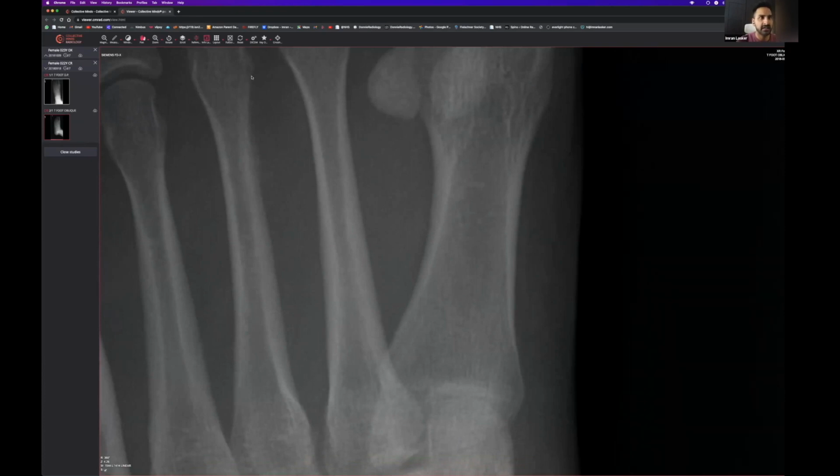And then you look at the third shaft. Can you see it looks a little bit hazy there? So I'll get the pen and draw it out. Look, going along like this, and then it doesn't look so crisp, and then it carries on like so. This side looks completely fine, but that side does not look good at all. It looks very irregular, very cloudy around there. So that doesn't look quite right.